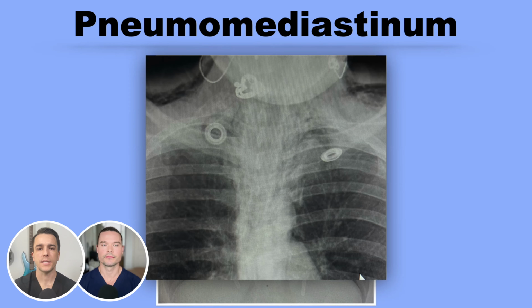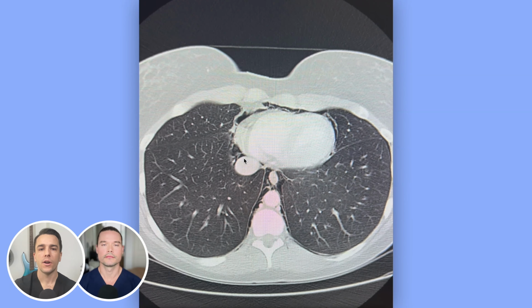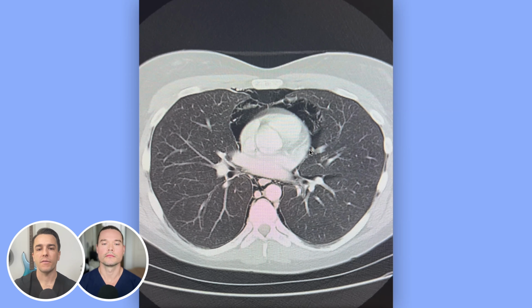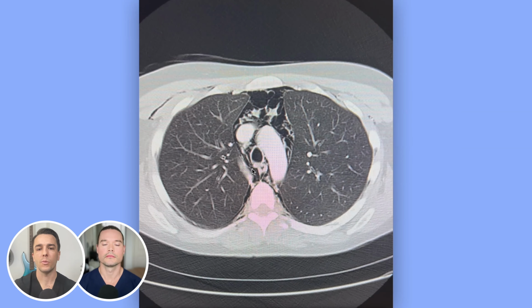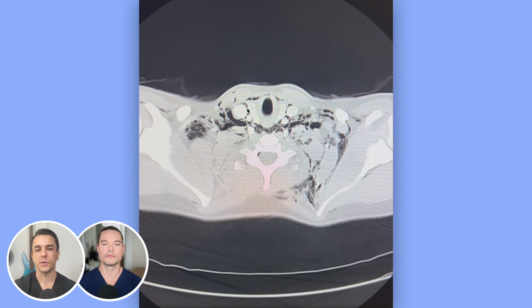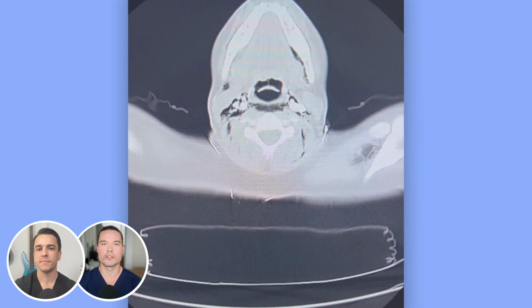And here's a CT scan of that same exact patient. As we're going up from the diaphragm, we already see these black areas, which is consistent with air, pneumopericardium, almost compressing the heart. Sometimes that can cause tamponade. And then we have the dark areas kind of just following the trachea all the way up, and the esophagus up into the soft tissue of the neck and upper borders of the trapezius. This is just bad, just real bad. That's a diagnosis of bad.